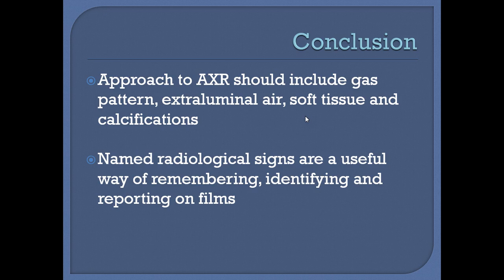So what is the conclusion? The conclusion is that the approach to abdominal X-ray should include gas pattern, extraluminal air, soft tissues and calcifications, and named radiological signs are a useful way of remembering, identifying and reporting on the films.